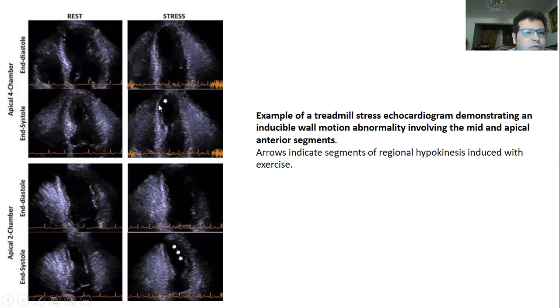We can appreciate here the apical septum is not moving; the endocardial excursion and shortening is much more evident at rest. Also the anterior wall.